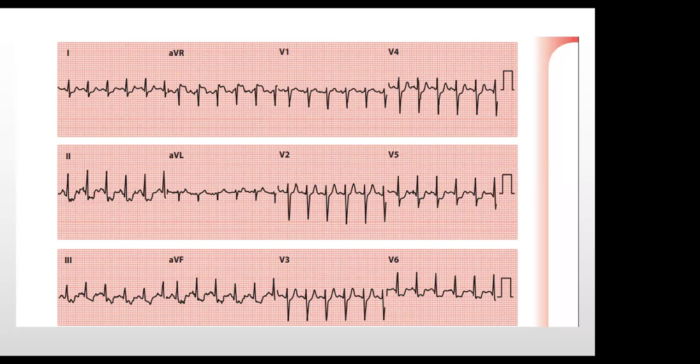Yeah, those are brilliant differentials. That's really correct. Good. Because we're looking at possibilities of what could be causing these widespread problems. And left main disease, especially with the elevation in AVR, is quite suggestive of that. Any comment from anyone? Okay, let's move to the next one.